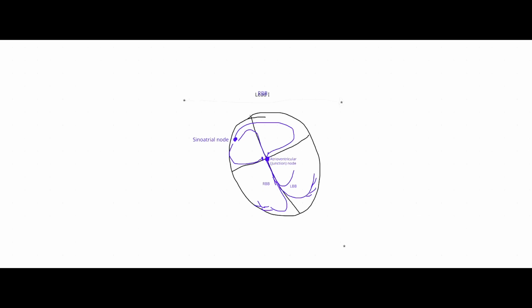And then you'll have 2 other leads, right? So lead 2, actually, sorry, this is lead... Yeah, no, that's right. Here, from here to here is lead 2. Okay, that captures lead 2.